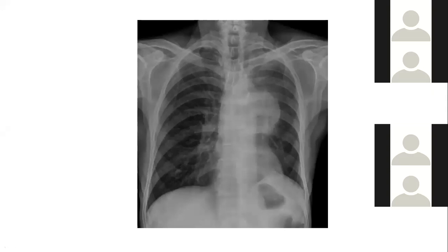Usually when there is a cardiomegaly, when there is just a chamber enlargement, or there is a pericardial effusion, there is always a slight gap between the cardiac margin and the hilar. The hilar is always lateral to the mass when it is because of cardiomegaly or a pericardial effusion. But if it is arising from the mediastinum, it goes beyond the hilar lateral margin and can project beyond it. So the hilar will appear as though it is hiding behind or in front of the lesion.